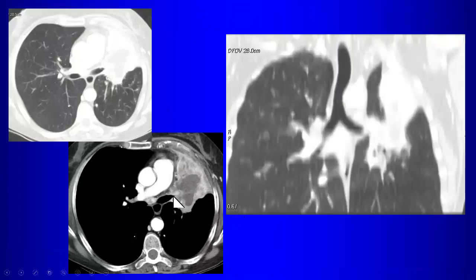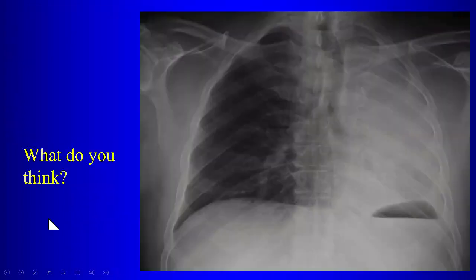So here again, we have a central tumor, somewhat necrotic. This was also squamous cell cancer with left upper lobe atelectasis, and this is how we get the Luftsichel sign. That's compensatory hyperinflation of the superior segment of the left lower lobe, which becomes border forming with the aortic knob, giving you that lucency. Luftsichel is air sickle. Okay? And what about this case?